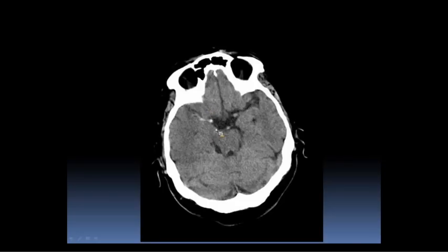So this is a really bright vessel, and if you compare it to the basilar artery and the left, this is the ICA essentially as it bifurcates into the M1 and the A1 over here. So this is the M1 we're looking at. It's a little bit subtle, and definitely this can be a subtle sign, and sometimes we go back and forth about them. But if you compare this vessel to these two vessels, it certainly looks brighter.